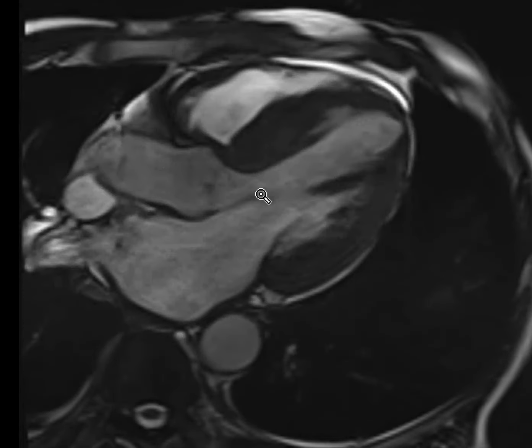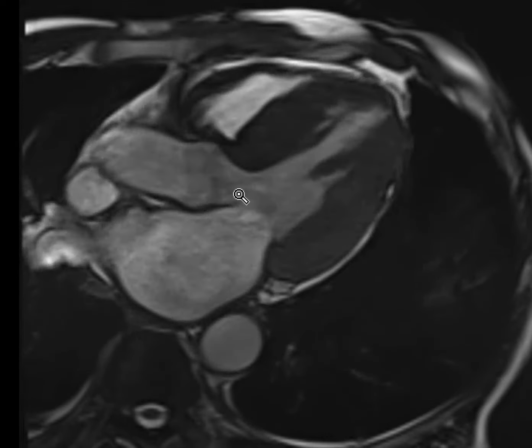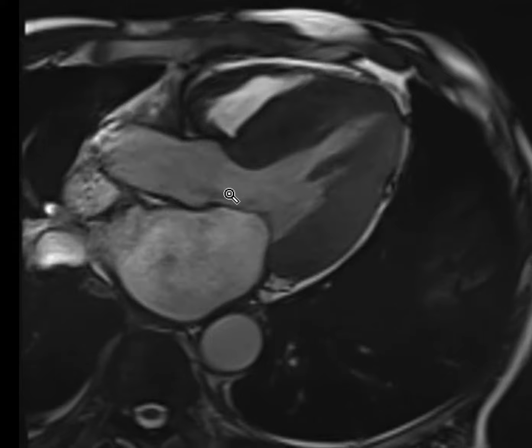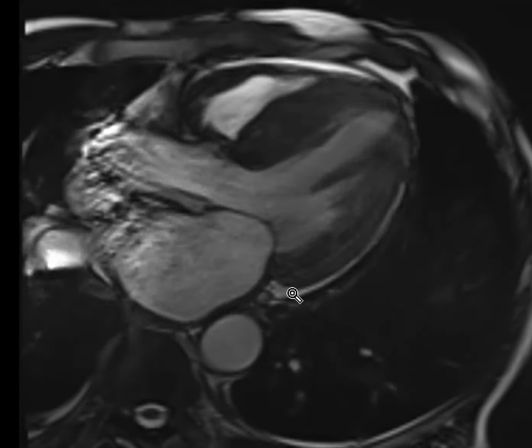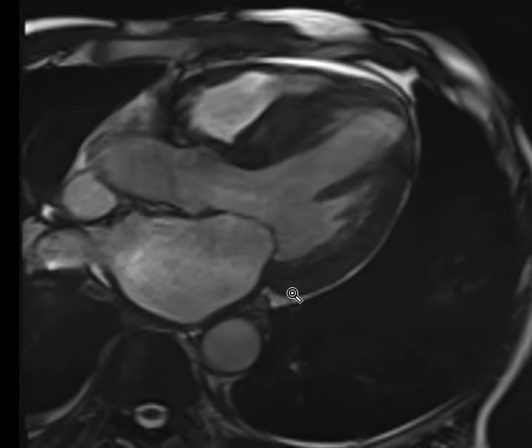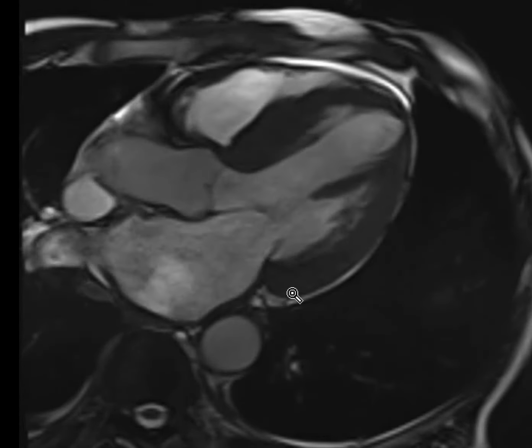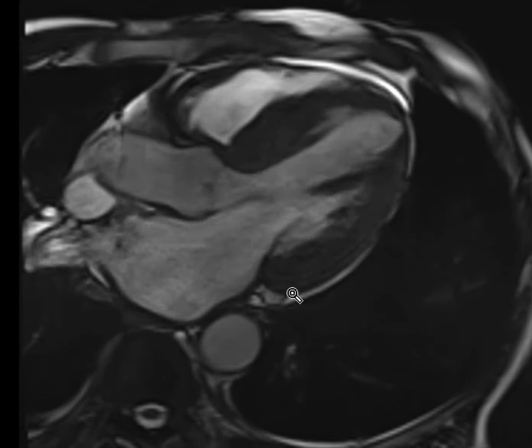However, there is no left ventricular outflow obstruction, and there is no regurgitation or aortic stenosis. There is no SAM. The hypertrophy more or less is symmetrical, which makes HCM less likely. The patient from history was not hypertensive, so hypertension is also excluded. And the clinical question targeting the MRI was to exclude amyloid disease.